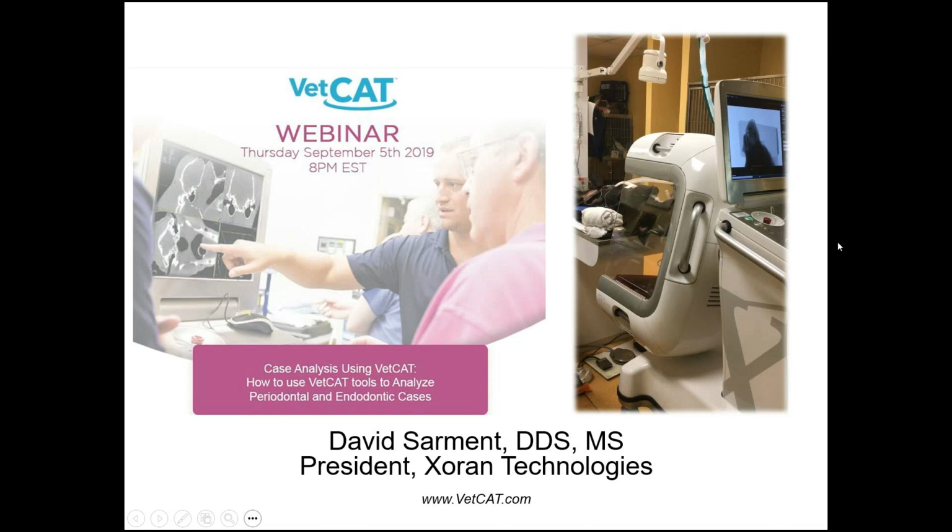I'm going to jump right in on today's topic. We're going to go over basic functionalities of VetCAT and take a good look at how we read some cases. And today we'll focus on periodontal disease and endodontic lesions in particular.